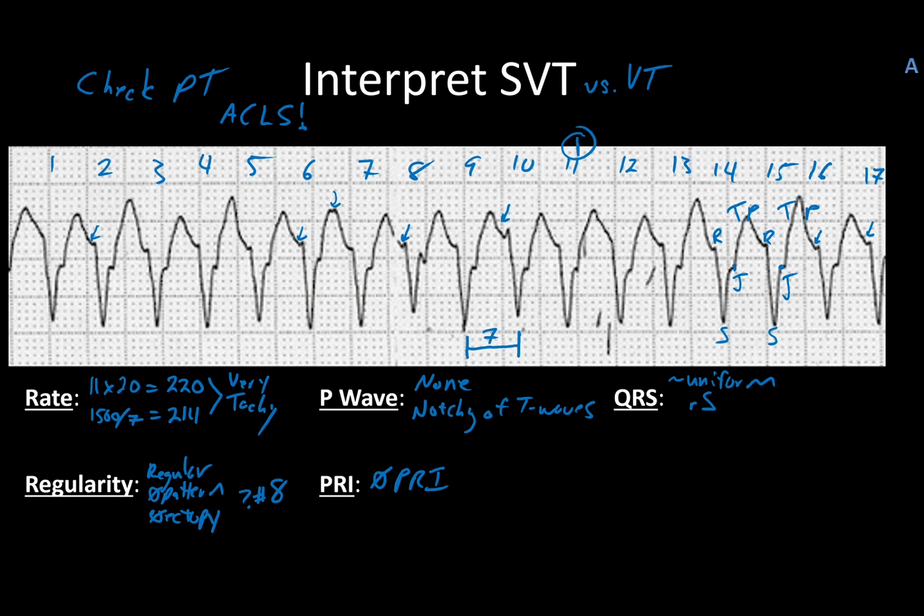In some cases, like this one here, beat number 11, definitely beat number 8, 4. It happens often enough. There is a small S prime that occurs before it moves on into the T wave. What's more important is that the T wave is opposite the QRS, so we do have to keep that in mind.